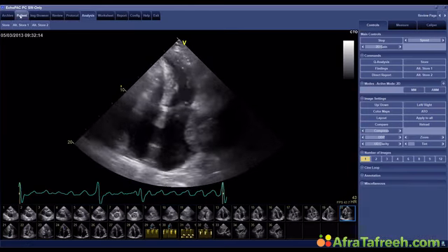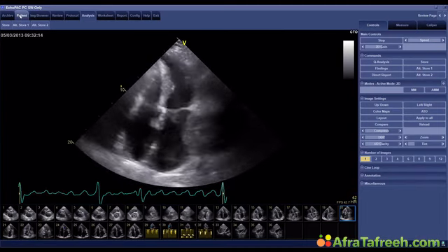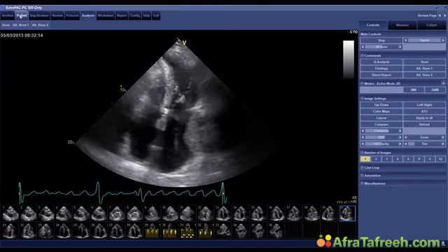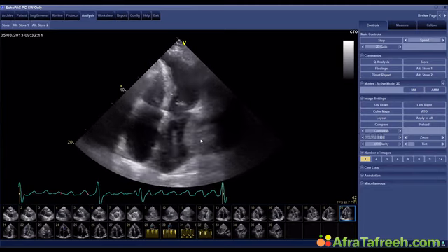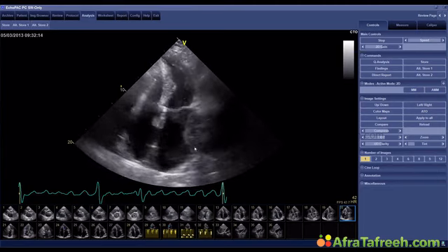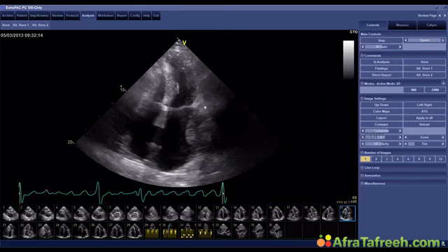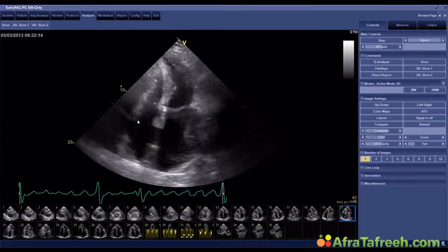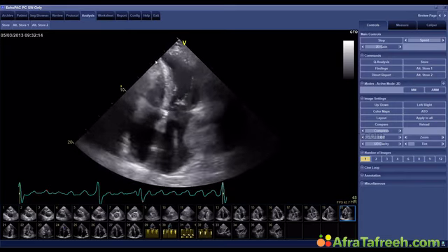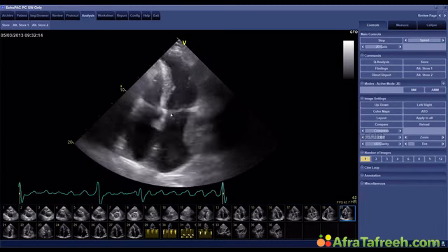Well, what we did in this patient was we were thinking actually about operating the patient and taking the thrombus out. It would have been a fairly large operation, even considering that you'd have to open the left and the right atrium. Well, one might even just think about the left atrium, because the right atrium, if it thromboses, would go into the pulmonary artery, which would also not be such a nice thing to have, a large pulmonary embolism.